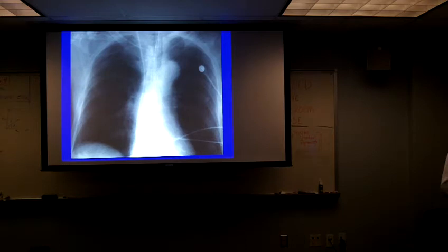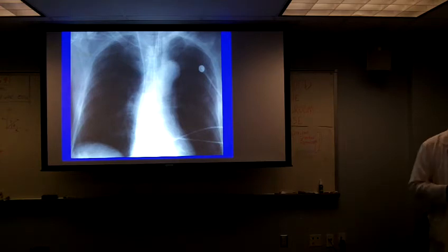So the key thing was recognizing that this is not in the normal venous course, and you don't just willy-nilly start pulling the catheters out until you know exactly where it is.